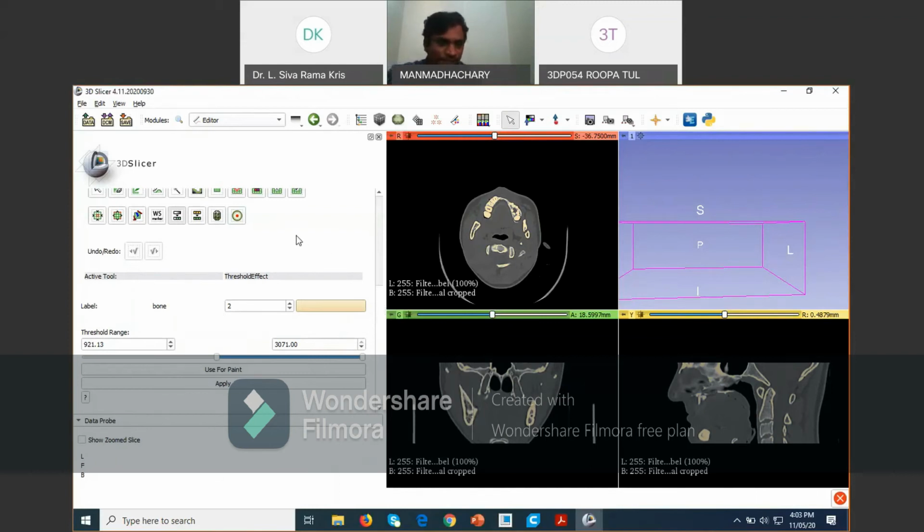Sir, in my one, after clicking the threshold effect, it is showing the active tool as threshold effect. But after that, the parameters that you are getting, level, bone, all those things, are not visible in mine. Are you choosing this fourth option, madam, threshold effect?